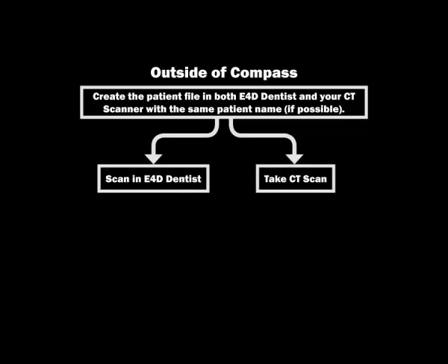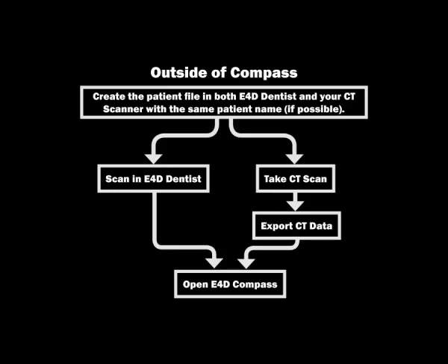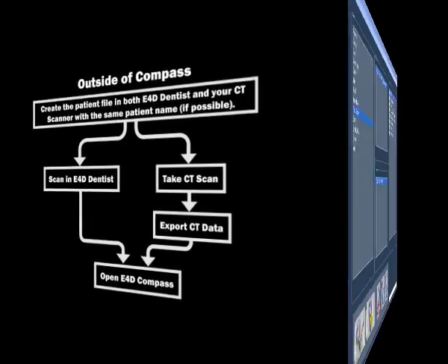Outside of E4D Compass, create the patient file in both E4D Dentist and your CT scanner with the same patient name if possible. Export your CT data and open E4D Compass. You will then manually import the CT data. The E4D data is imported automatically.